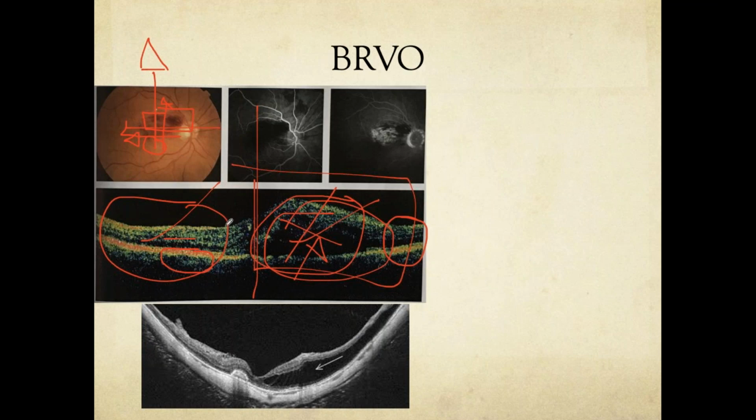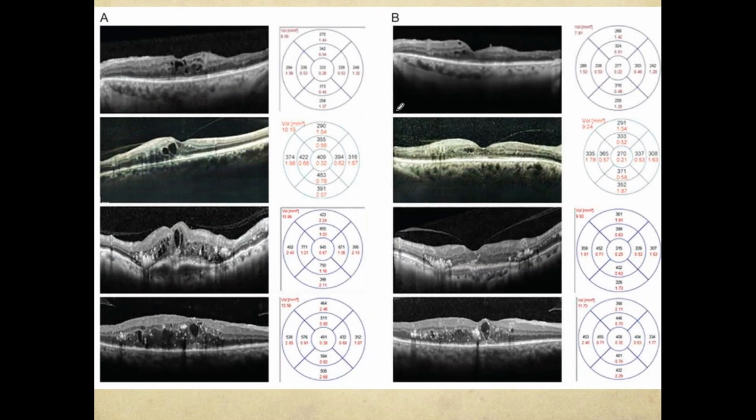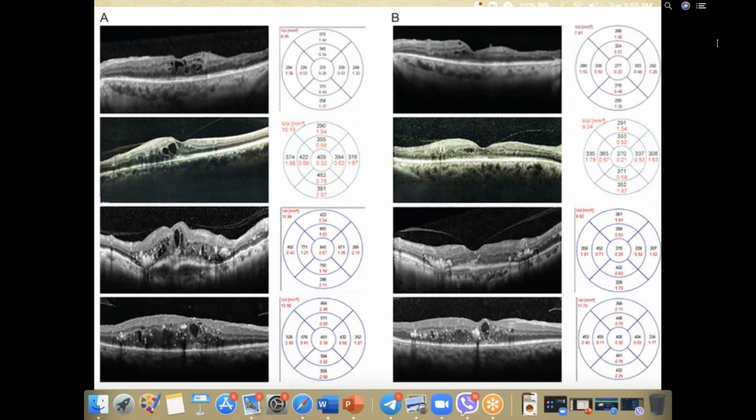So even in this, which is a cystoid edema, I cannot really say what the visual acuity will be at this moment. But after one injection of Avastin, when the edema subsides and I'm able to compare the normal with the insulted retina without the edema, when I look into the elements of the retina and compare after the edema resolves, then I might be able to tell what would be the outcome in this patient. Right? So these are some of the examples.